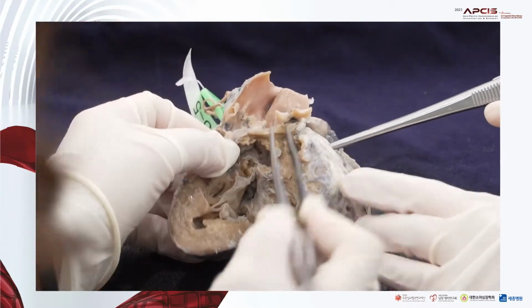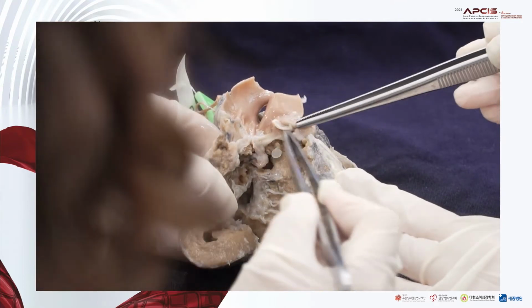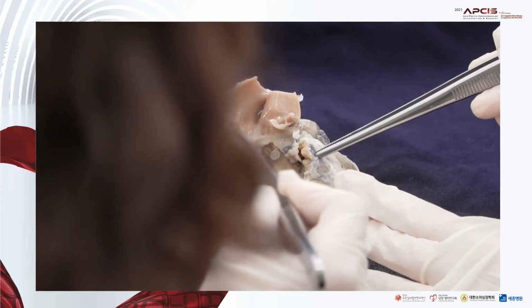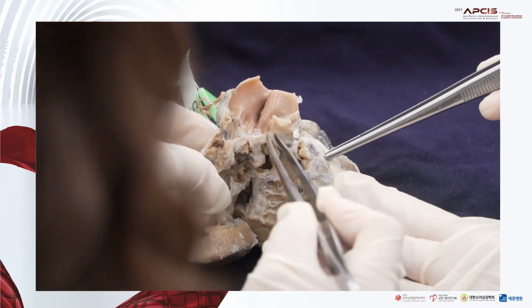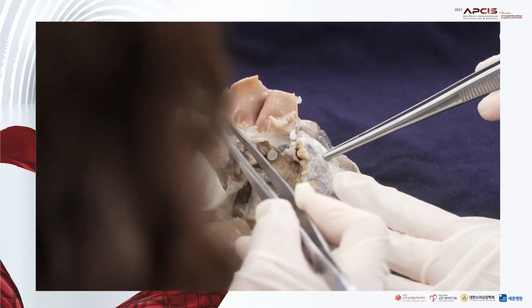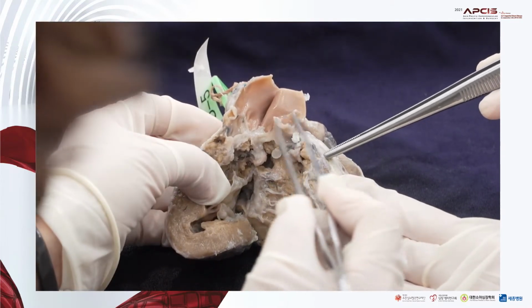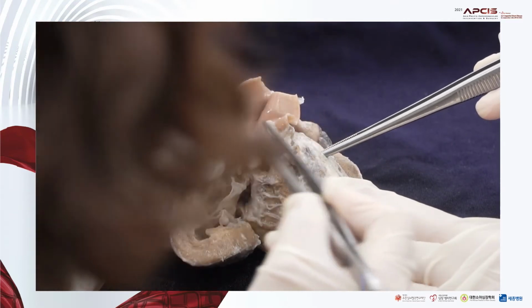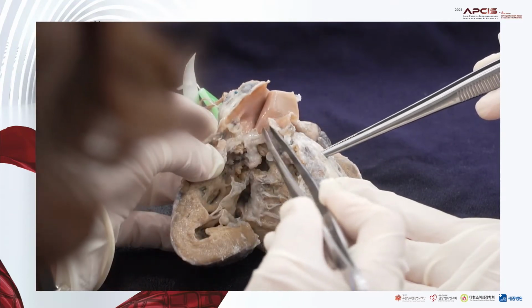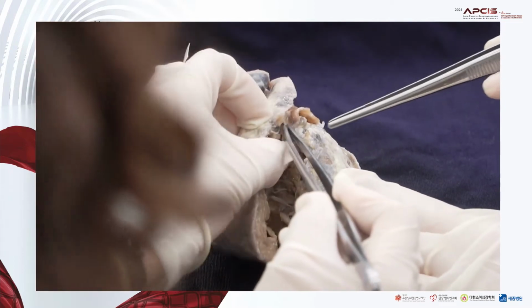And then in this case, this one also had an operation. So let's see whether the pulmonary valve has three cusps or is bicuspid. I think this one has one cusp, and I think this is the dividing cusp.